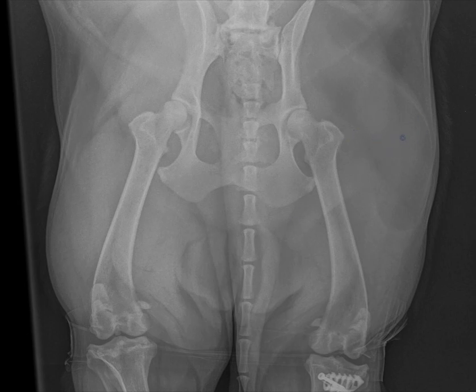Therefore, I would conclude that we have a fat-based mass of the left quadricep muscle region, which is concerning for something like an intermuscular lipoma. Other causes of fat mass can include intramuscular lipoma or even infiltrative lipoma. These can be assessed very readily and differentiated with CT. However, on radiographs, there can be some overlap in the appearance of various lipomatous masses.